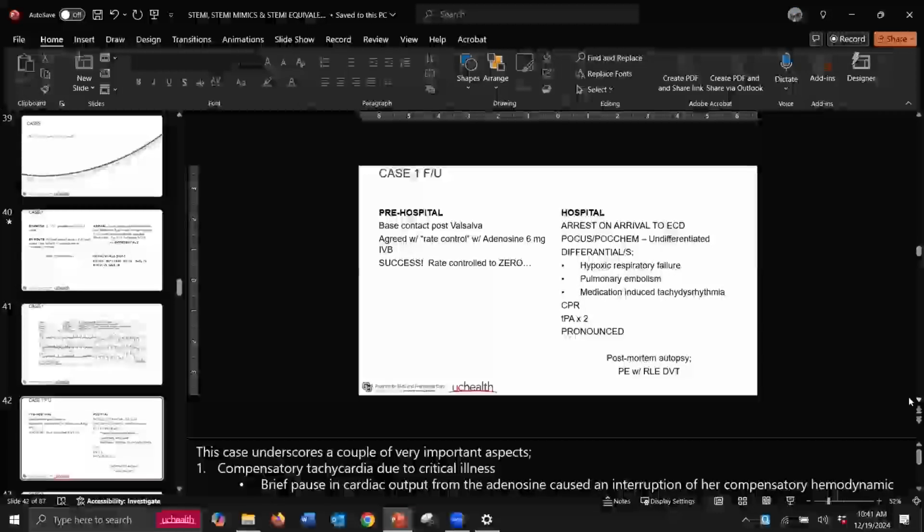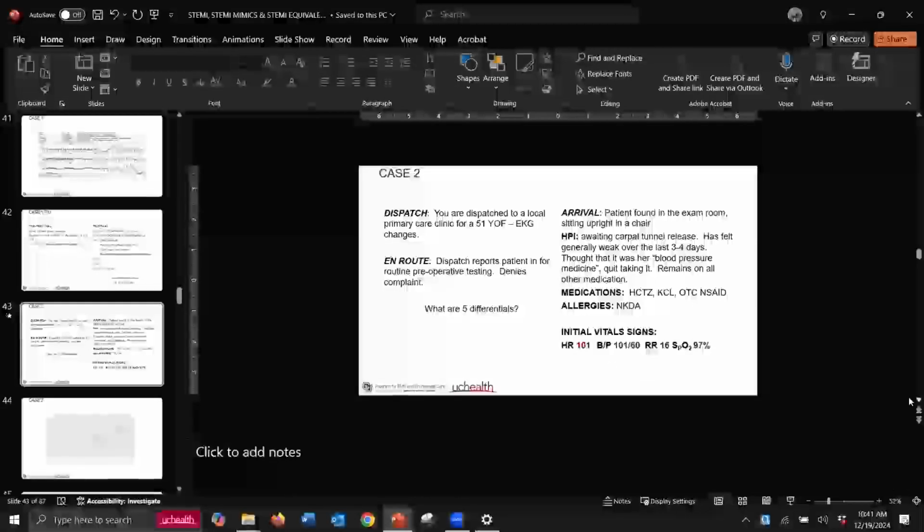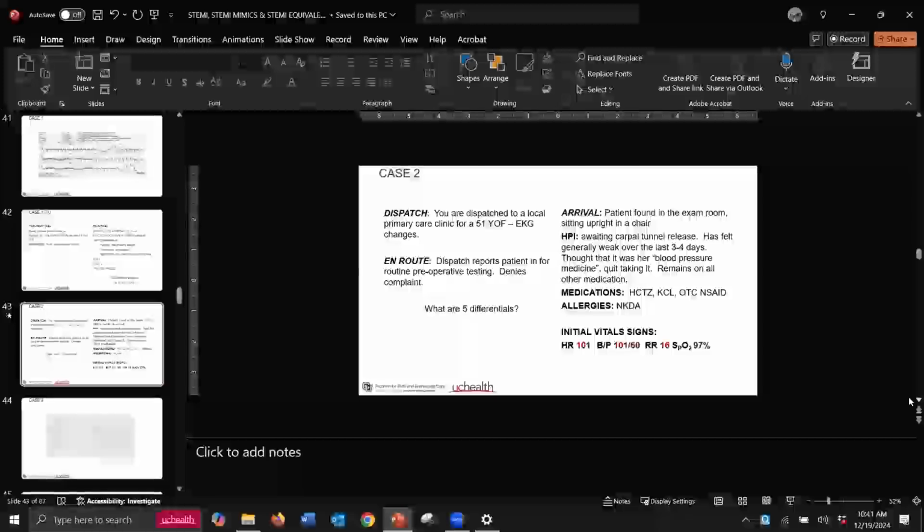Questions, comments on this? Absolutely. What was the rate originally? 170, I think is what it was. Did it have P waves in it? Yep. It did.